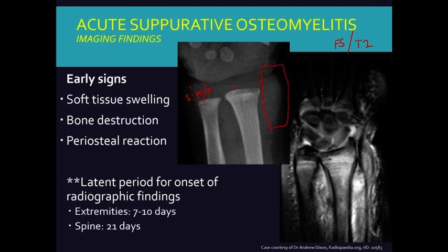So we can see that infectious change causing the swelling. We can see where it's also not just in that subcutaneous region, but also in the deeper muscular tissue going down, and then in the bone as well. So we have all this change between the radius and ulna as well. We have all this change seen throughout the metaphysis into the diaphyseal region.